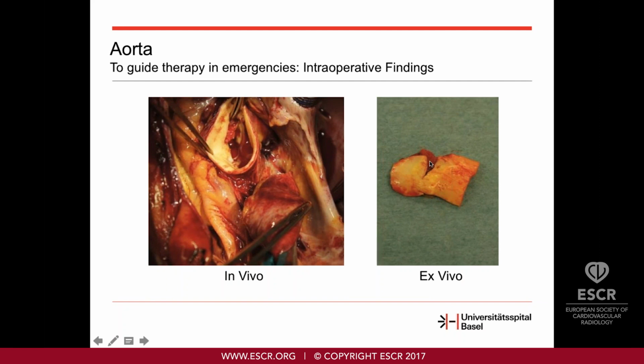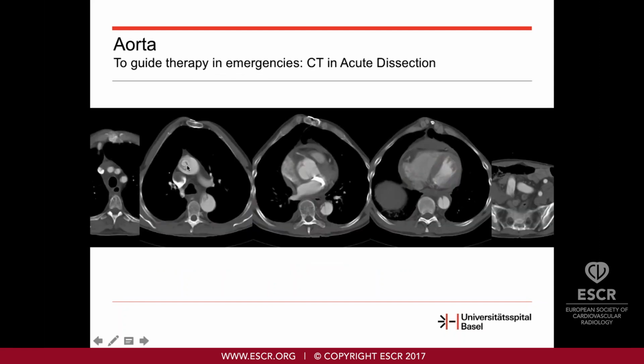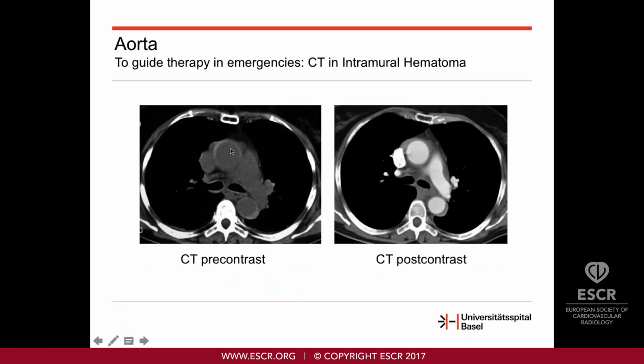So to distinguish between aortitis and intramural hematoma, we did MR. And here you see these are FLASH images before contrast material, after contrast material, and here we see we have an average signal intensity of 150, and here we have 360. So it's a substantial uptake, so this is aortitis. And also we see these irregularities of the carotid artery.